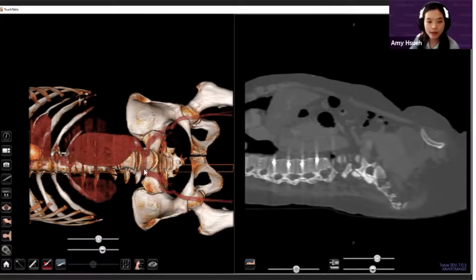And so we have this aneurysm. Any information that we have on these cases will be located in this eye.